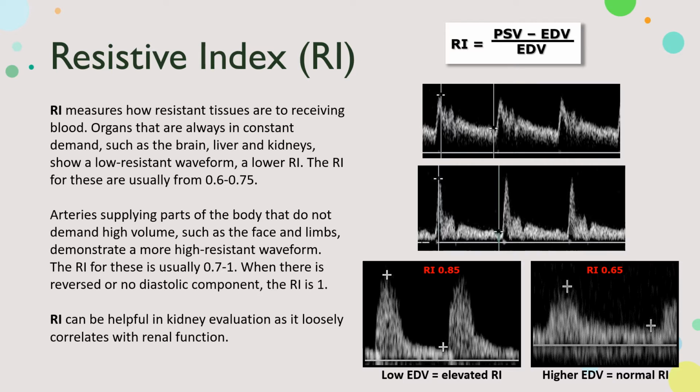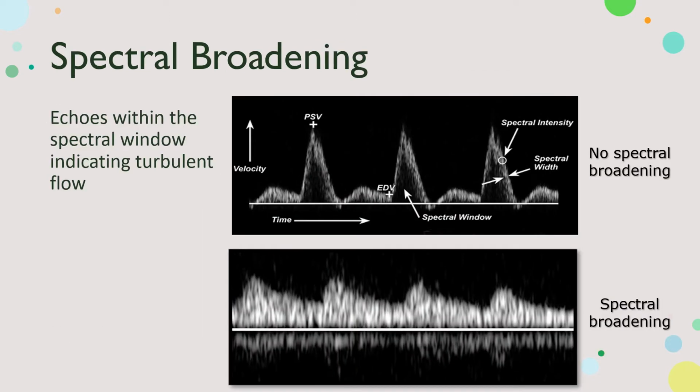Now, the RI can be helpful a little bit in the setting of kidney evaluation. It loosely correlates to renal function, but as we've learned over time, RI is definitely not something to hang your hat on. So I mentioned spectral broadening a few minutes ago.